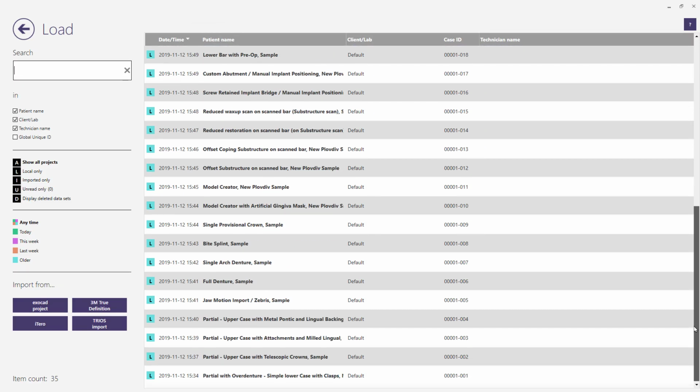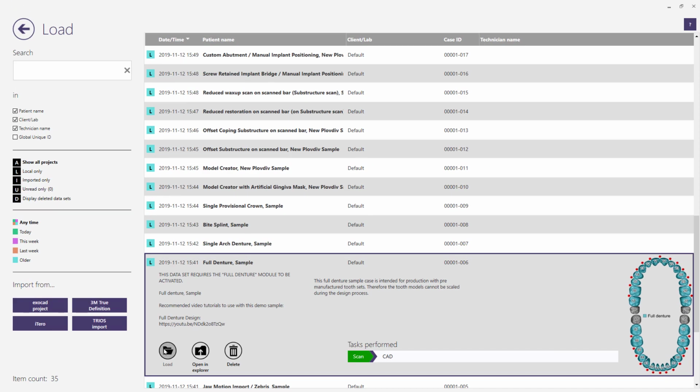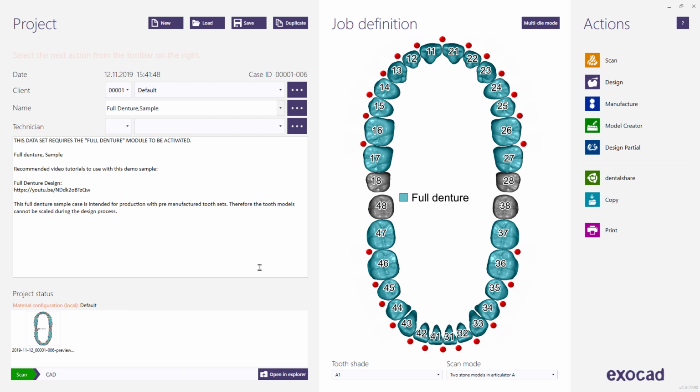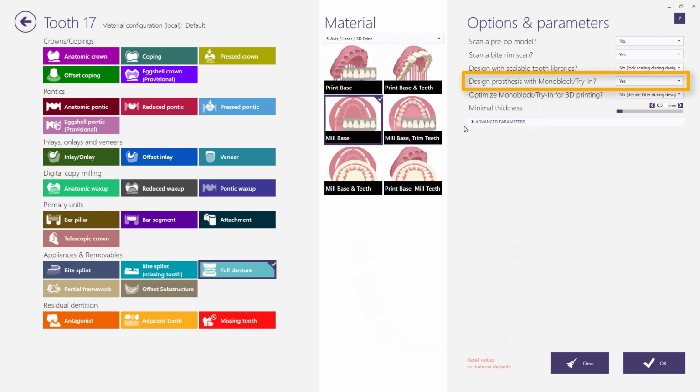In the Denture module, the software provides new manufacturing methods for all denture situations. Milled or printed production methods may be used for denture bases and denture teeth. For production of the monoblock try-ins, you can now easily export and save a monolithic try-in denture during the design workflow in the wizard. Note: monoblock can only be created for open and semi-closed libraries.